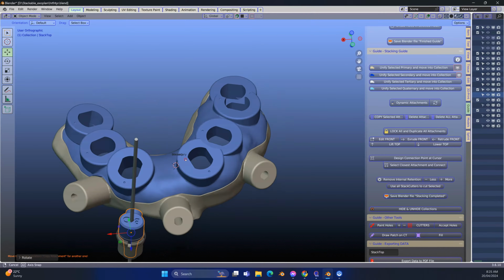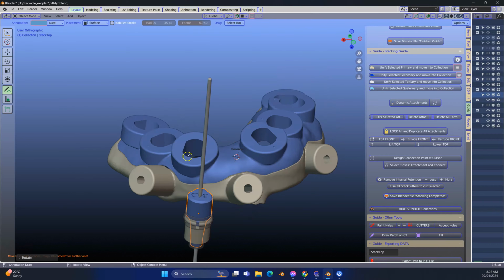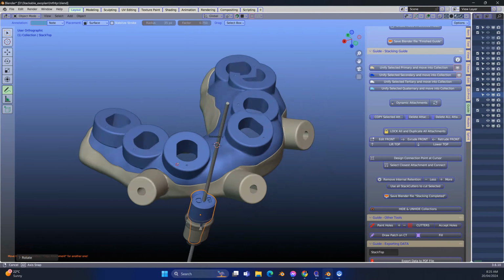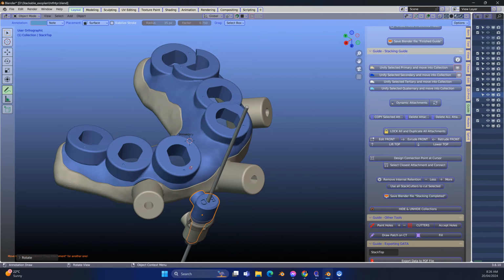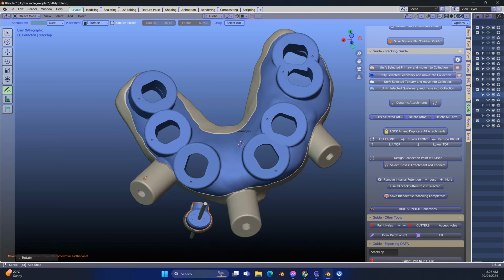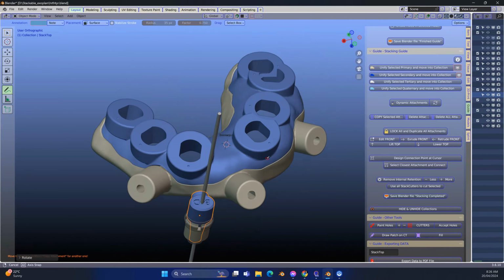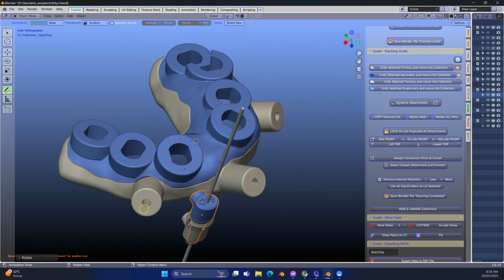Now, here's a kicker. You're going to have to select places where you can connect this to. Okay, so it's no good connecting this up here. Okay, so you're going to have to look for a place to connect these up with. Okay, so if I connect this one up here, it's difficult because we've got this one.